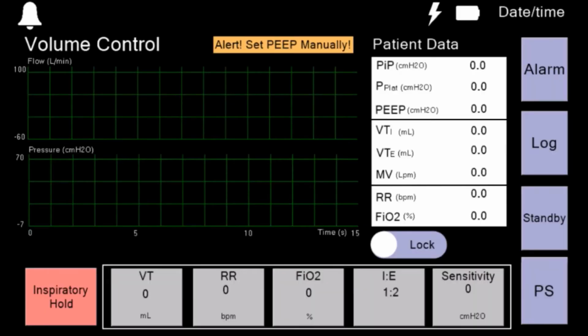So I'll first walk through the volume control mode. During our design process, our team considered that our user would most likely be exhausted, using gloves, and that there would be a lot of ambient noise in the environment. We also made an assumption that most of our users are right-handed or use one hand to operate. With that in mind, the screen is essentially divided into 3 different zones.